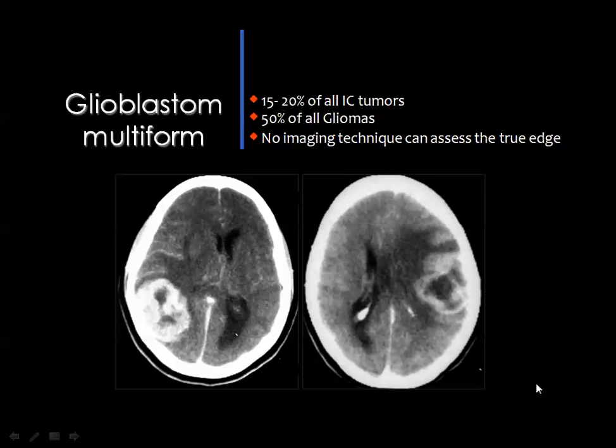You see here a tumor with non-enhancing areas representing intratumoral hemorrhage and necrosis, which are features of this type of glioma. And you can see the extensive perifocal brain edema around the tumor, compressing the lateral ventricle, which is totally collapsed. And there is some displacement of the midline structures, as also you can see here.